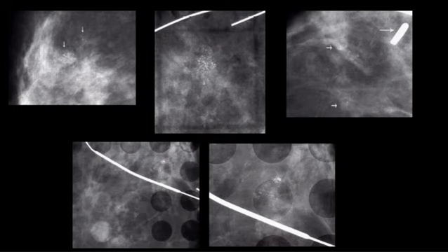Many more calcifications are evident in the specimen. The appearance is similar to the initial presentation, and histology of recurrence was diagnosed. So she had this one, they removed it, 2 more foci developed, they removed them, and by imaging the removed specimen there are multiple foci of tightly packed calcification, which was recurrence.